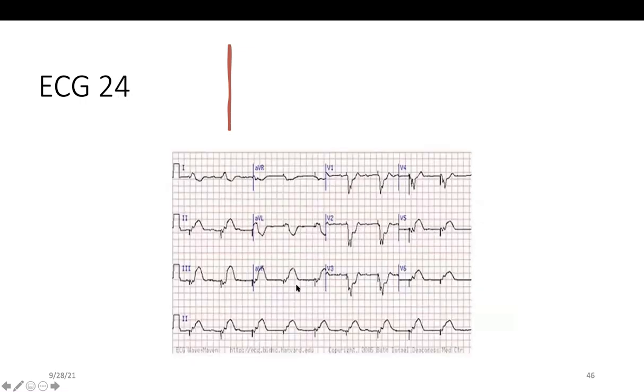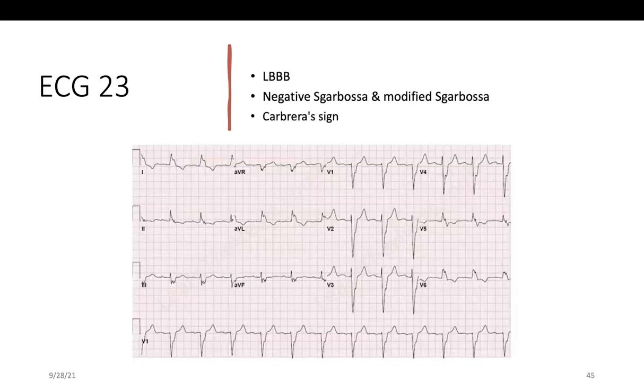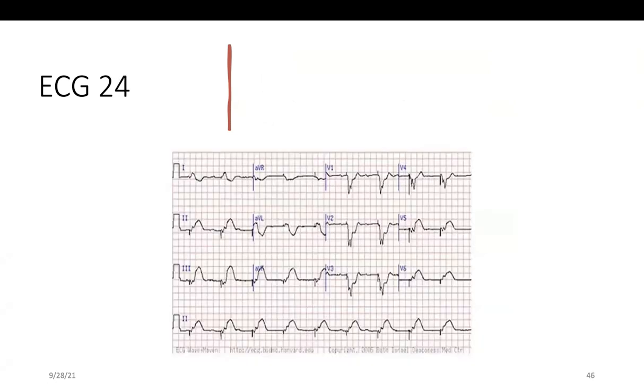Okay, let's look at this ECG. Of course, here there are no signs of ischemia, as you see. There's no concordant or discordant ST depression. We have only one criterion, which is more than 5 millimeters, but this is only 2, so it does not count. You need more than 3. Okay, what about this ECG?